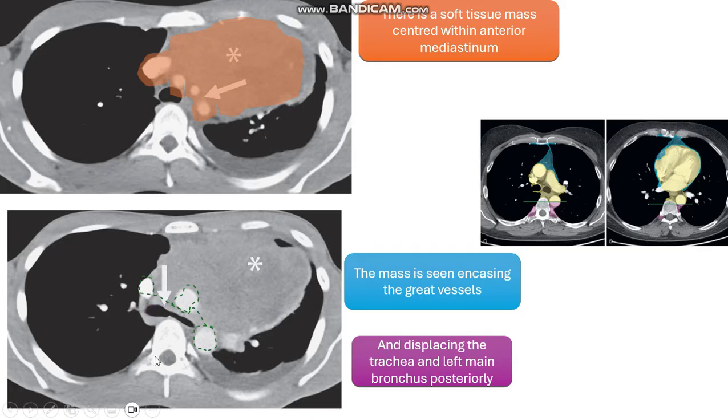Okay, why here I see the left main bronchus like this? Because the left main bronchus is horizontally oriented and it is longer than the right. The right is shorter and vertically oriented, so it can't be delineated like this. Okay, it can't appear like this.